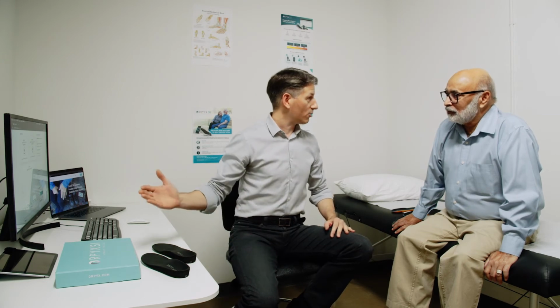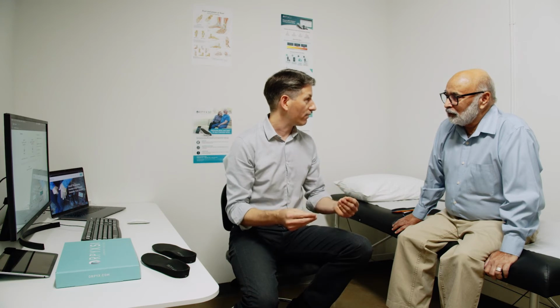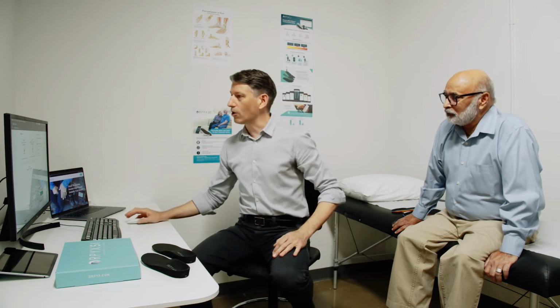If you notice a decrease in wear time or encounter an alert, talk to your patient about the importance of adherence so they can get the maximum benefit from their insoles and remote patient monitoring service.